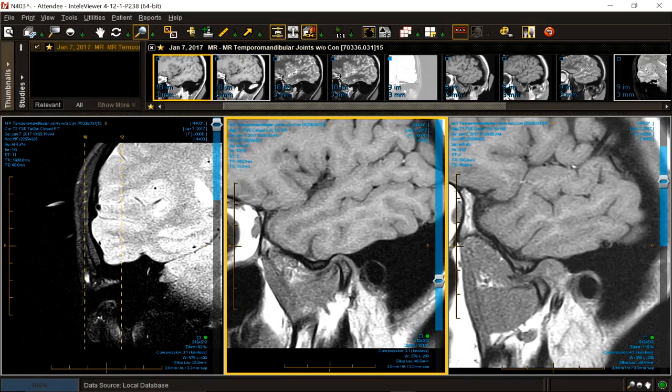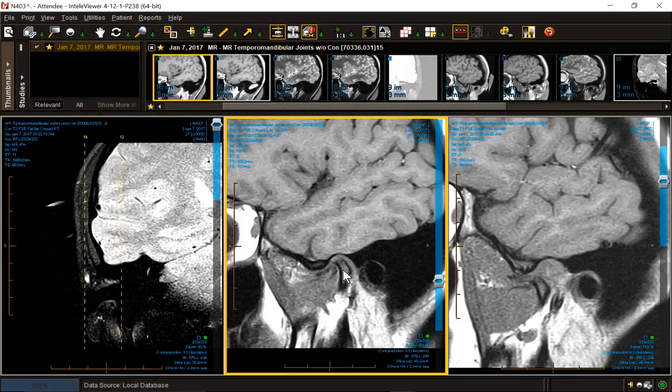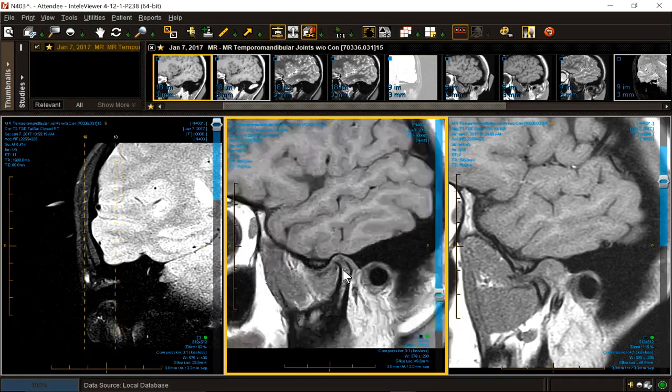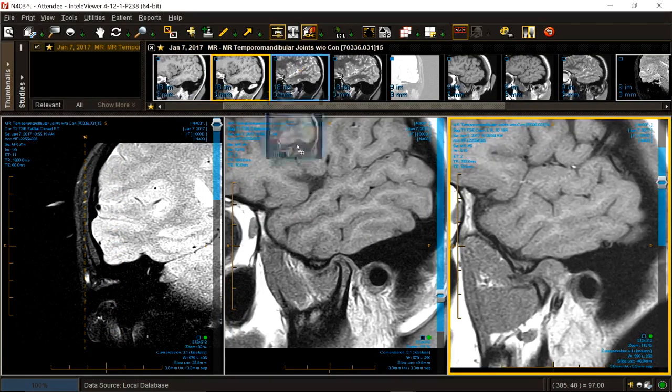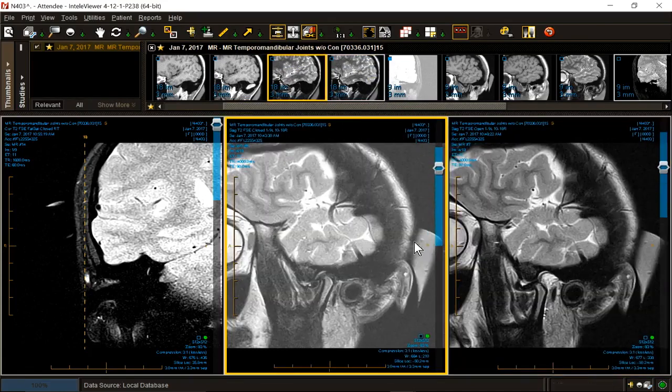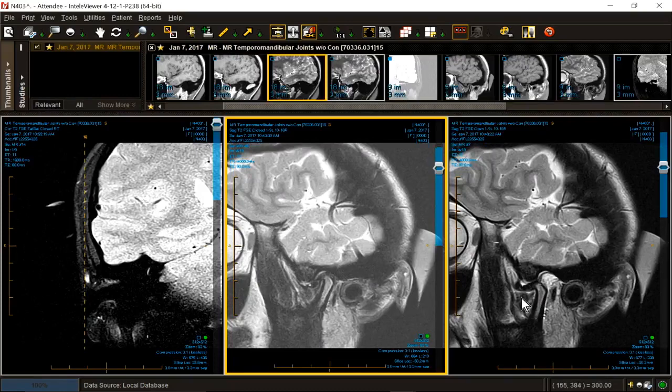This girl needs an operation before she is 24 and can't open her mouth or chew anymore. She needs that operation. Mandibular osteotomy realignment. She's a perfect candidate. And this will resolve. See if there's any more information that comes out of the T2. I doubt it. A little bit of an effusion. It's in the upper compartment as it usually is.